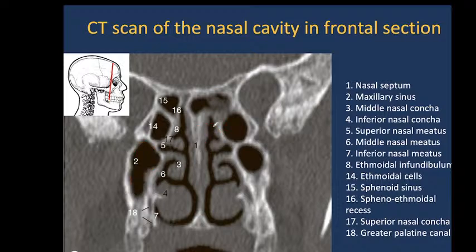Here you see a normal, absolutely normal structure in the nasal cavity.